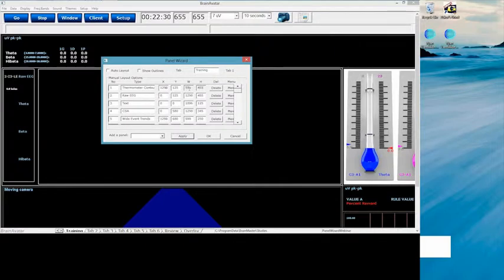Also in this, you're going to notice that it has a width and a height. WH: width is, of course, how wide it is, and height is how tall it is. And you're also going to notice one other thing, that some width and heights are grayed out. That's because currently in this version of software, in this revision, those panels cannot be adjusted.